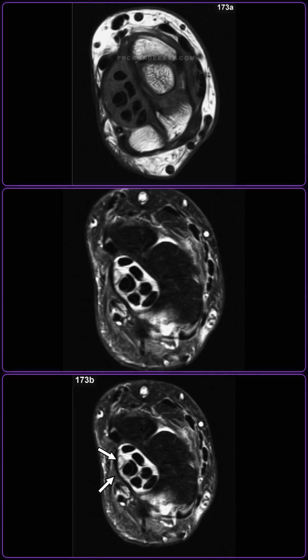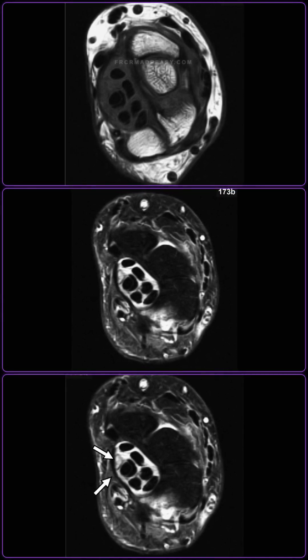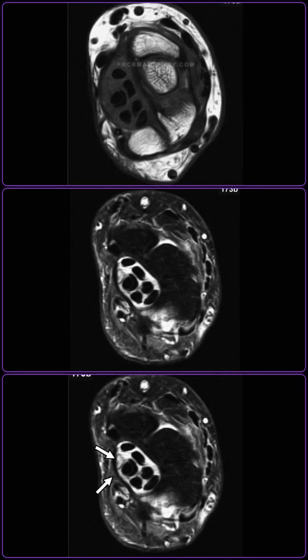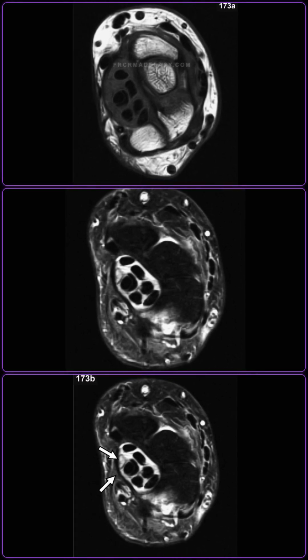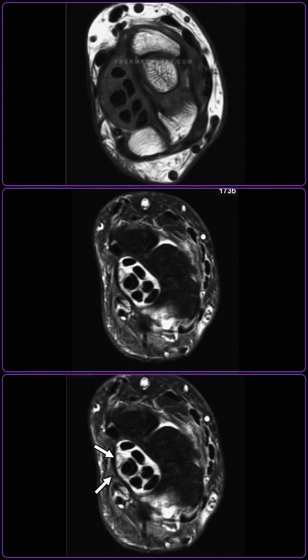I am showing you an annotated MRI image of the wrist from this patient. Identify the structures indicated by the arrows and discuss their clinical significance. In that case, the upper arrow points to the swollen hyperintense median nerve, which shows increased T2 signal secondary to intraneural edema. The lower arrow indicates palmar bowing of the flexor retinaculum, which is defined as a displacement of the retinaculum greater than 2.5 millimeters past a line connecting the pisiform and scaphoid tubercles.